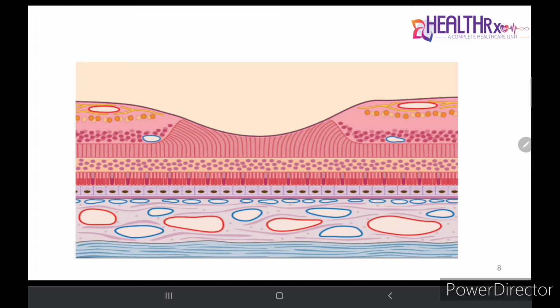Now since we are understanding the anatomy of the retina based on the OCT, we need to understand what an OCT does. Well, OCT performs high resolution cross-sectional tomographic imaging of the internal microstructure of the retina by measuring back reflecting and back scattering light waves from different microstructural features within the material or tissue.